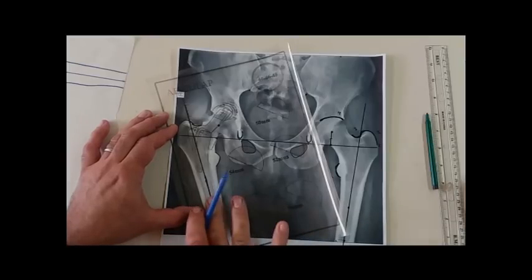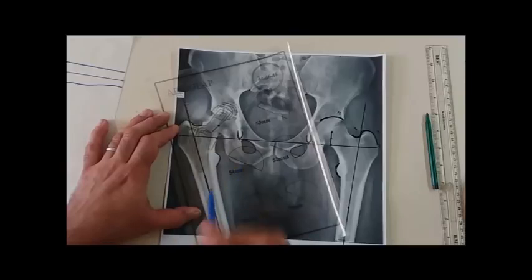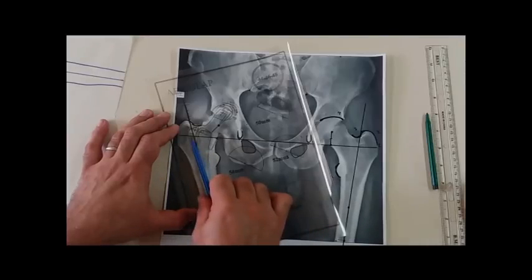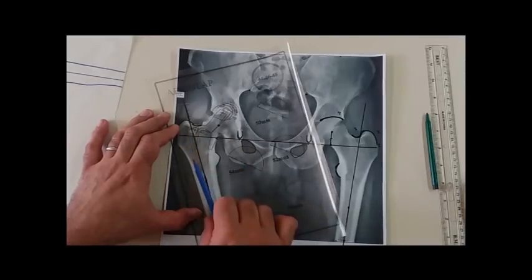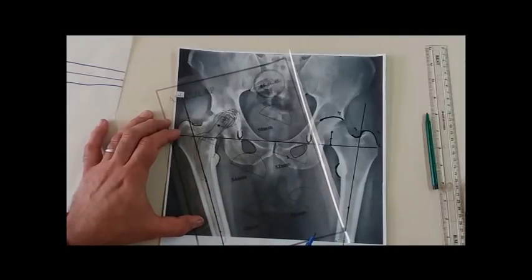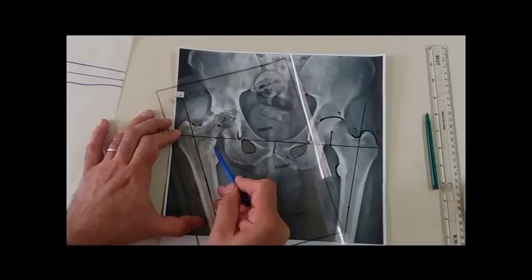In the cementless stem, I am not too flexible. I should depend on the bone geometry. So my descent or ascent in the stem within the femur depends on the geometry of the bone compared with the stem. I shouldn't go much below, because in this case I should remove this part of the neck, which is not acceptable.